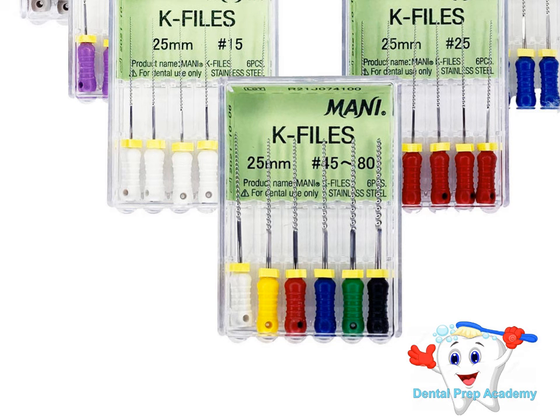So here is another file packet that you can see. I am talking about the file packet which is in the front, which has got different colors in it. This one is having sizes from 45 to 80. Now look at two things: just because the files range from white to black, you cannot say which file number it would be having.